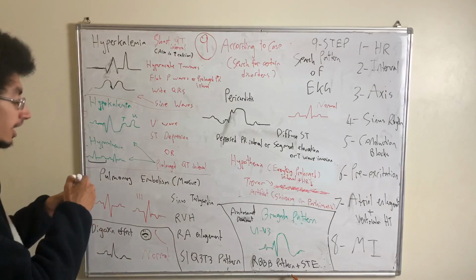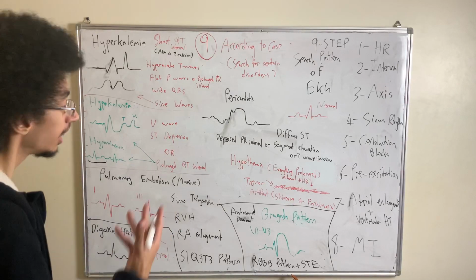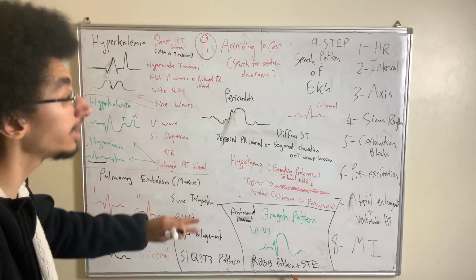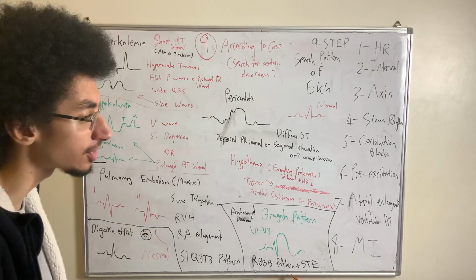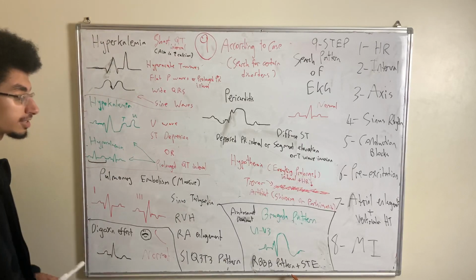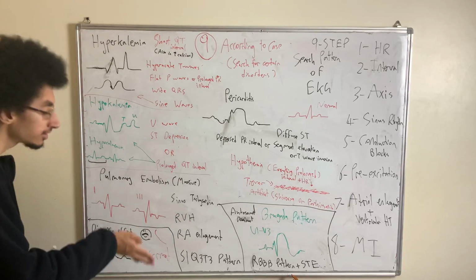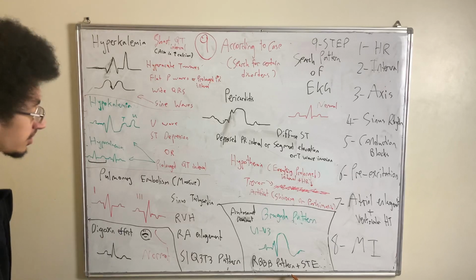So this is known as the digitalis effect. And by the way, this is normal. This can be seen in people who are taking digoxin at a therapeutic level. But if people have digoxin toxicity, they may come with any arrhythmia: bradycardia, AV block, anything. And it's very, very life-threatening. But at a normal therapeutic level, it may give you the digitalis effect, which is a Salvador mustache-like downslope, kind of like a downsloping ST segment depression, at the end of the QRS, all right?